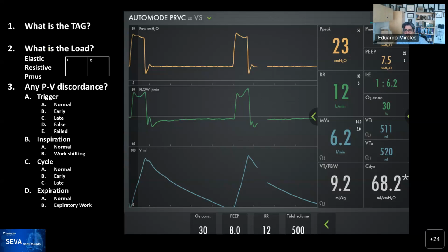And it's what we call type 2. And it's, sorry, adaptive. All right. Very good. So what does that mean? At least in this sample, if I didn't put the mode up here, you would not be able to distinguish the mode. In reality, you probably would just say this is pressure control.